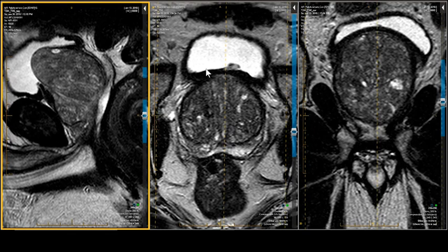Now, we're right smack dab in the midline. There are 4 lobar types of BPH. Type 1, the enlargement is anterior, pushes the urethra posterior. That is clearly not happening here. What's happening is the central zone of the central gland in the TZ region, or the posterior-superior quadrant in the sagittal projection of the prostate, is enlarged, pushing the urethra down and forward.